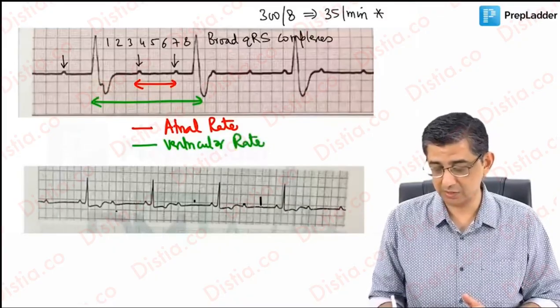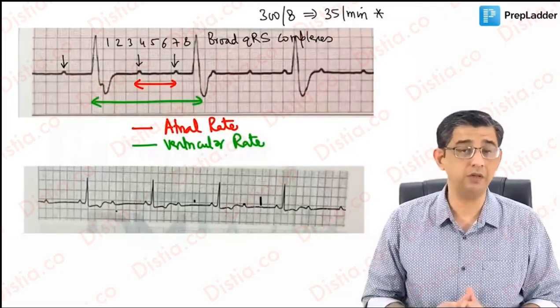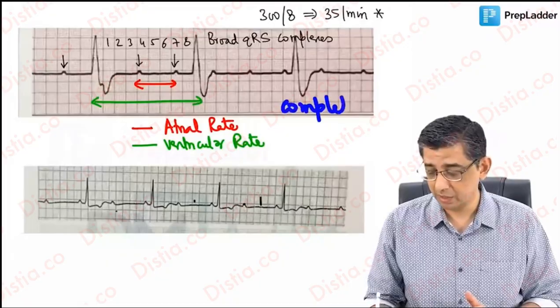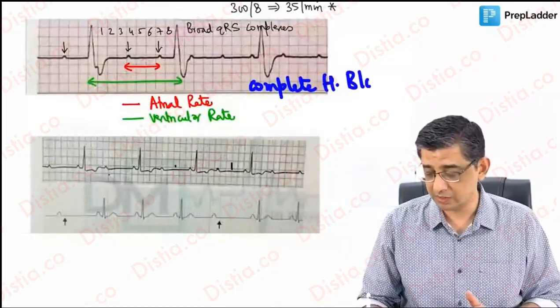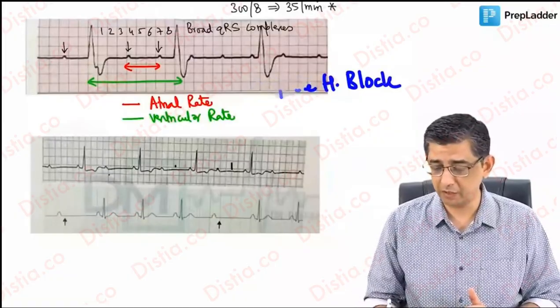In those circumstances where the atrial rate and the ventricular rate will not be matching, the chances of this person having a fatal event in the form of a head injury are dramatically increased. So the diagnosis in this case would be given as complete heart block. The alternative name for complete heart block is third degree heart block. This has AV dissociation, so can even be having those frog waves present. Frog waves simply means that they would be fluttering in the neck of the person.